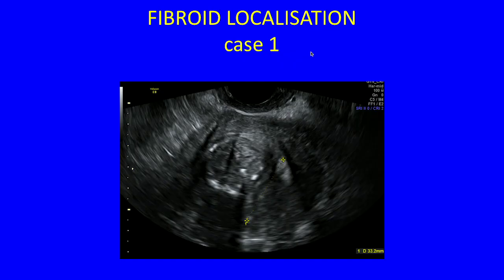For fibroids, it's a bit difficult to apply 3D because you get so much shadowing, and therefore your 2D image often isn't very good, as we all know. But the 3D image is only ever as good as your 2D image. If the 2D is no good and you haven't spent time optimizing it, your 3D isn't going to be very good either, and by default with fibroids, that's very much the case. But I've chosen some examples where it was really useful.